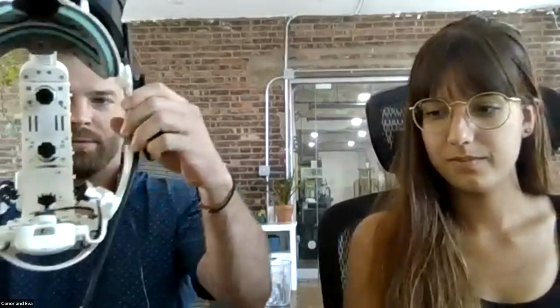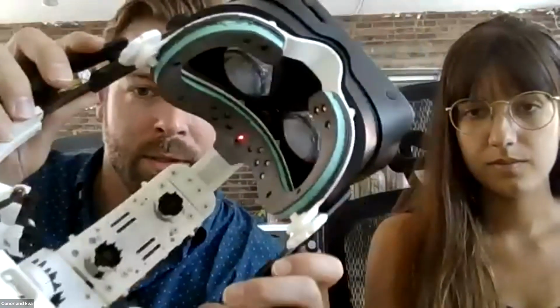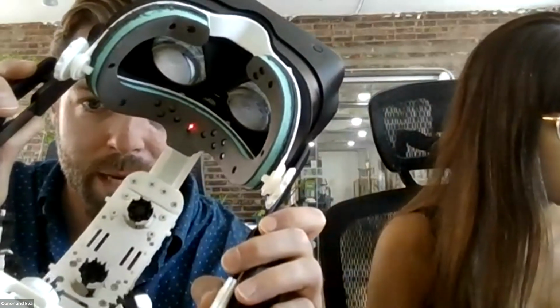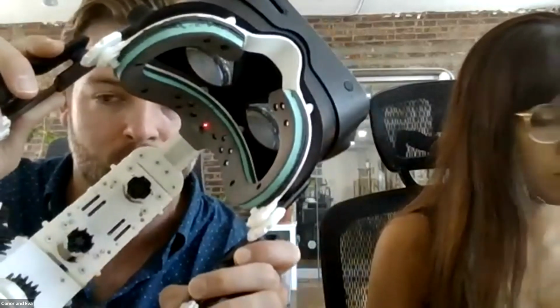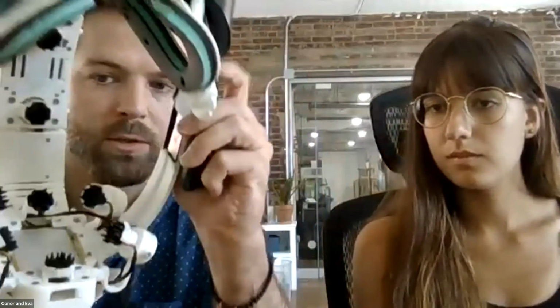We're going to show you the headset that I'm about to put on. So here we have a Galea Alpha prototype. You can see in there, we've got the face interface with the PPG currently emitting the light from the LEDs, and then all the other sensors in the face that we can talk through in a minute. And then in the back here, we have the 8 active electrodes on the harness that goes onto the head. So without further ado, I'm going to put this on.